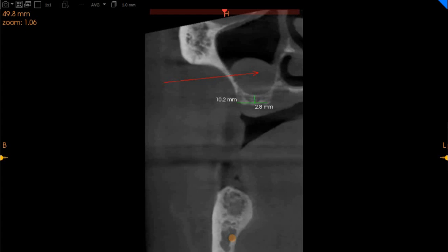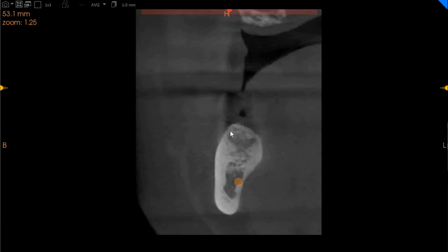Moving to the lower right segment, it can house a second molar very comfortably. Here you can see right there. So we've got measurements of approximately 8.6 millimeters of ridge width with approximately 12 millimeters of ridge height. Moving to the lower anterior region, we've got good quality bone. This is D1 level bone. We've got approximately 4.7 millimeters of width with approximately 12 millimeters of height in the lower right central incisor.